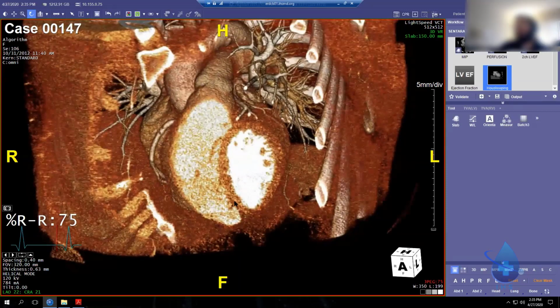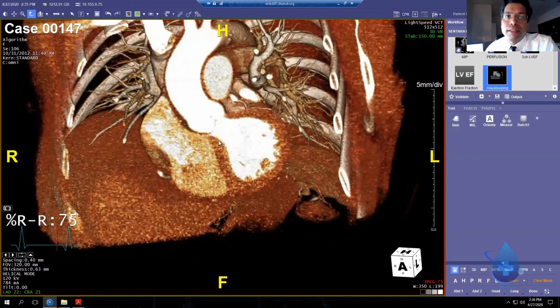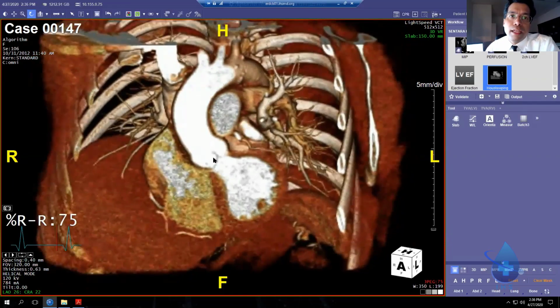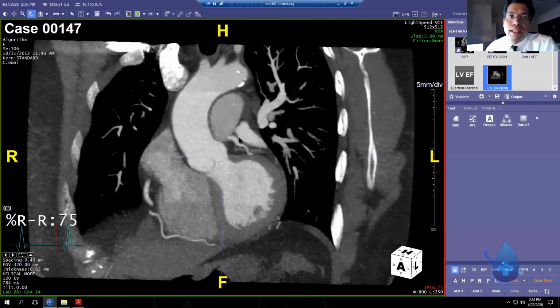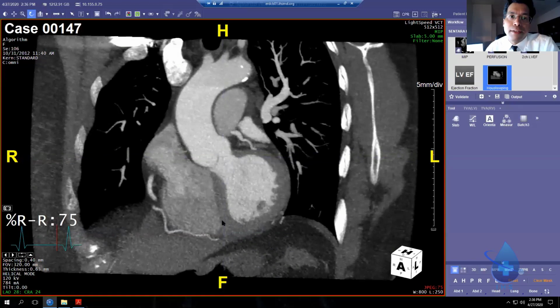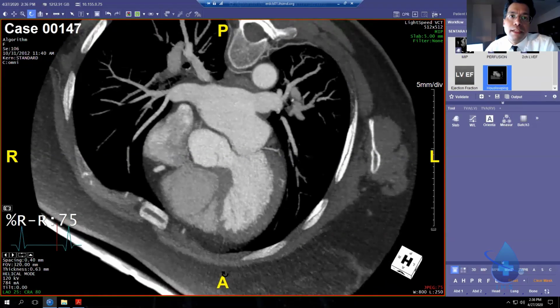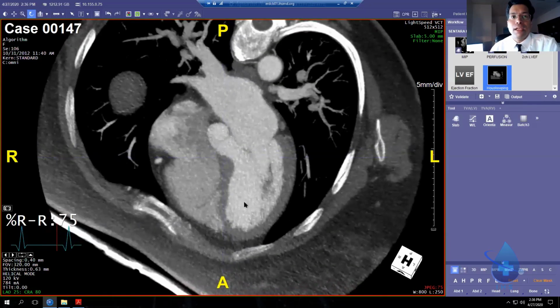And that's why the EF is lower for the RV. Okay, all right, I can't pimp you on that. You're absolutely right. So the RV volume is larger. Now, if I find the aortic valve and put it in my crosshair, if I put it in a 4-chamber view by left clicking and rotating down the septum, left click, rotate down the septum. Okay, now tell me, which is the larger volume, RV or LV?